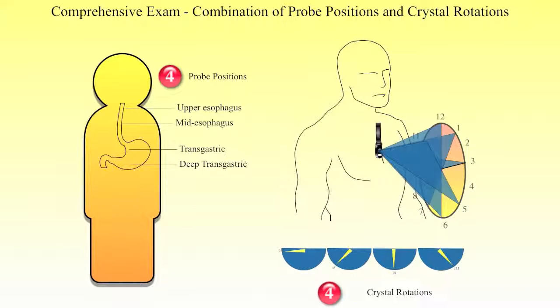cardiac structures. The images that follow will describe the standard exam in detail and reference their standard depths and angles unless otherwise noted. The HeartWorks simulator is used in the following slides to show an idealized TEE image alongside an anatomic representation.